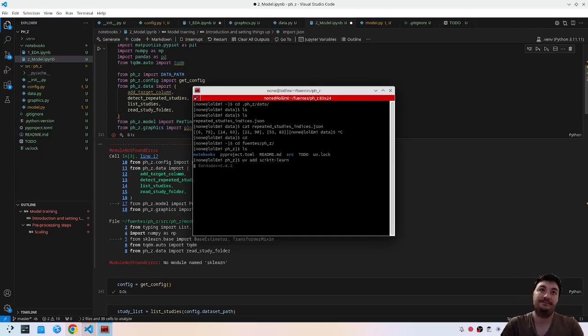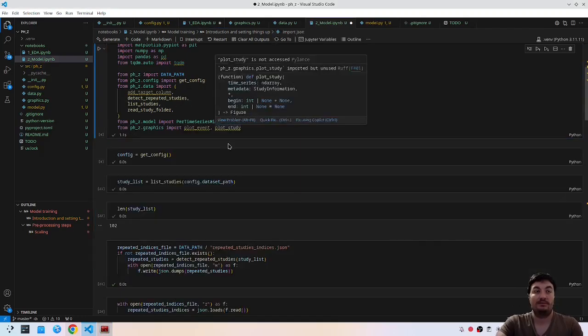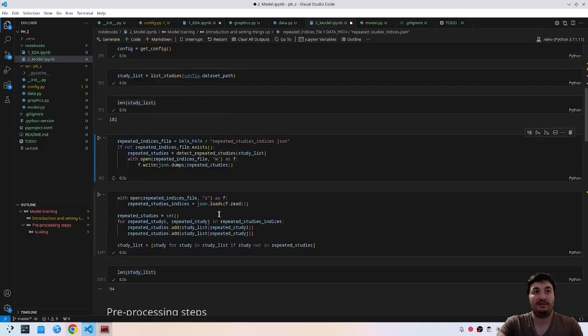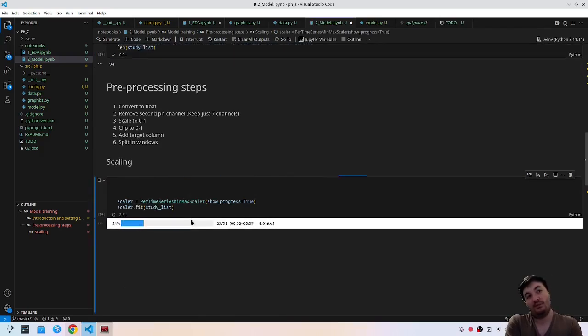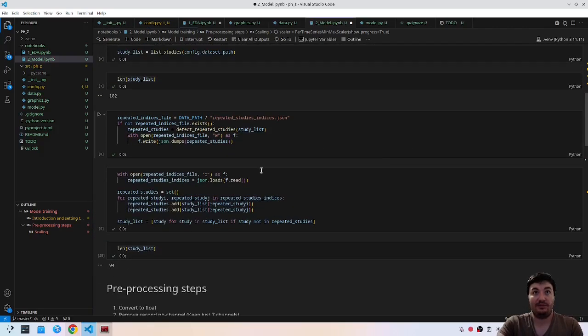Scikit-learn. Okay. This thing good. Let's try this. Okay. We are fitting, and then let's see, just to try if this is working.